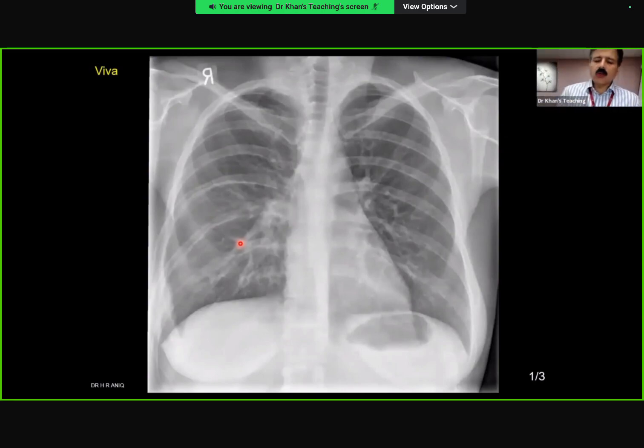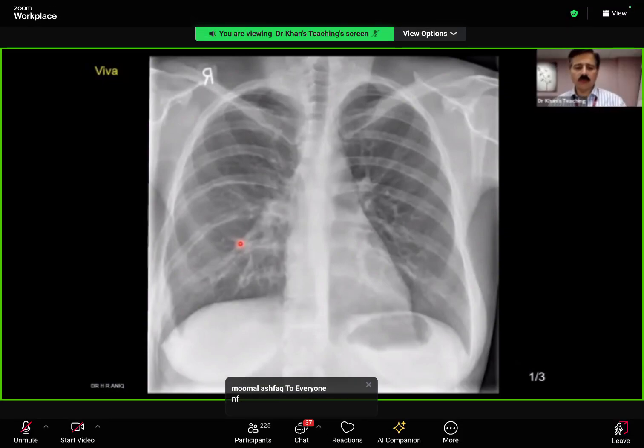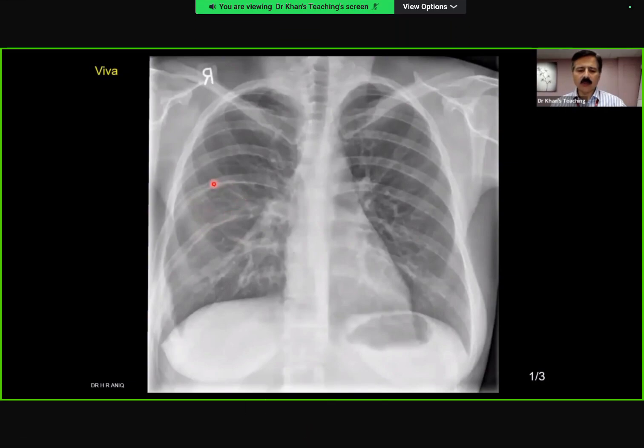So I am going into a differential diagnosis from your chest world, which is classical for your exam. And this is what? Heading of the differential? Rib splaying? Inferior rib notching. Oh, notching, okay. Classical, absolutely classical 2B film, where you can see that there is rib notching here, there is rib notching here. You picked up this thing very well. This kind of finding you will only pick up when you go through your protocol, and ultimately you pick it up. It's a subtle finding.